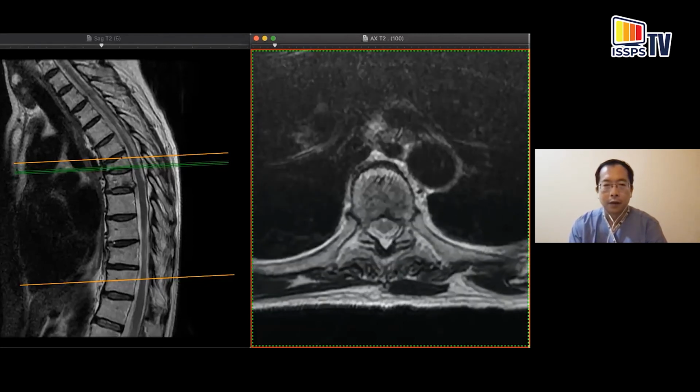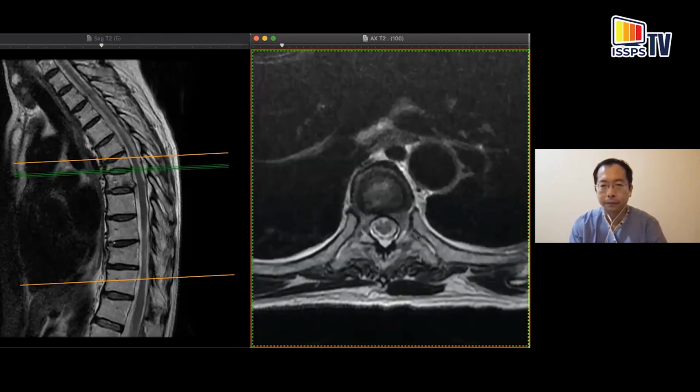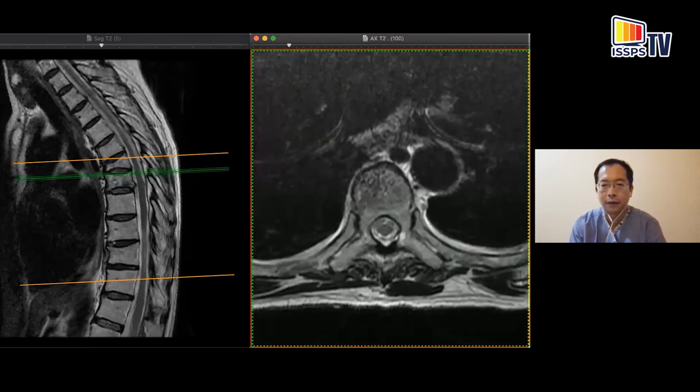So once you are at this level, you have access to the intervertebral space should you wish to have that. The facet joints, the ribs. Now we are at the level of the transverse process again of the next adjacent vertebral level, the well-defined costotransverse joint, the costovertebral joint. There's no way to access into this level here.